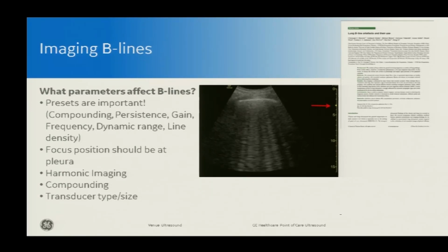One of the advantages, for example, of using a phased array transducer is that you can quickly go from the heart to the lungs to the abdomen without ever switching a transducer. You may want to do that when you are an emergency room physician and you have got a patient who's crashing in front of you and you need some fast answers. You don't want to even take the time to change the probe.